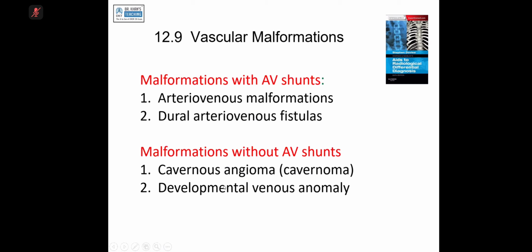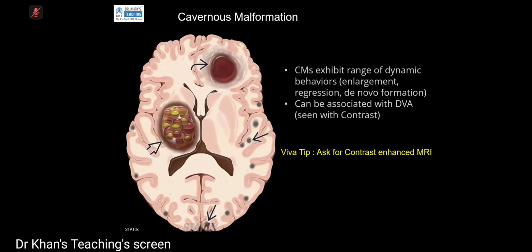These two are very important for the exam. Cavernoma is a favorite in the exam, and there are so many manifestations which can come. Please remember that the radiological features will depend on the size, etc., and they will change. Another very important point to remember is that cavernomas can grow, by the way. They can increase in size and number. And I've got a 2-year follow-up of this scan. I'll show you.